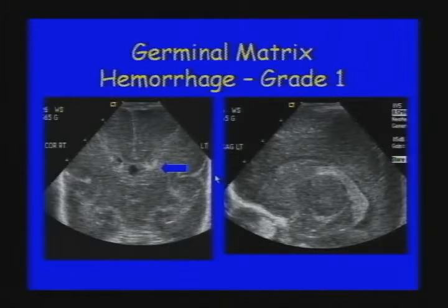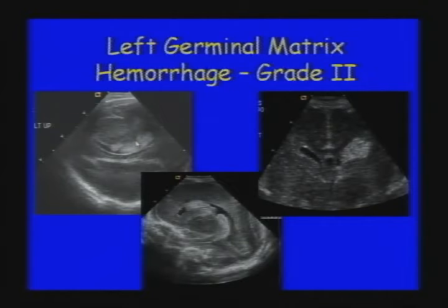You can see that this is a very preterm brain. There's not too many sulci and gyri. And you have to know the gestational age of the infant to be able to know whether you think you're dealing with abnormal brain development or not. If somebody told you this was a term baby, you would say, wow, there's something wrong here. But for a preterm baby, that's okay.